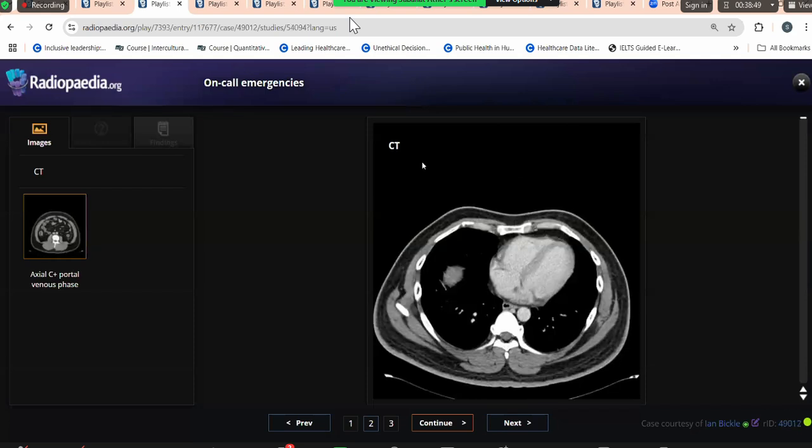Okay, candidate 3. So this patient, again from A&E, the surgeons have called you and are requesting the CT abdomen because they think that this case is not acute appendicitis as per their assessment. Go ahead and tell me, what do you think of the CT abdomen? Yes, ma'am.